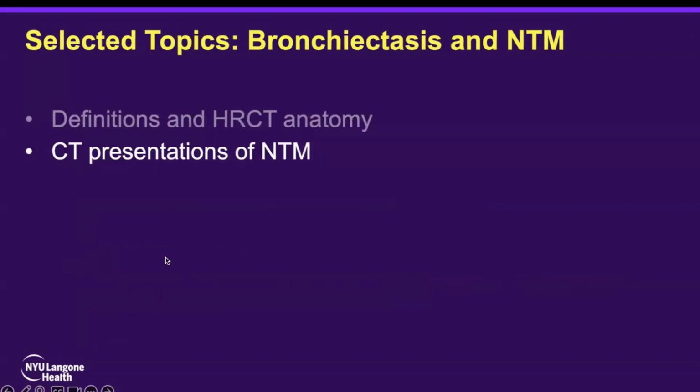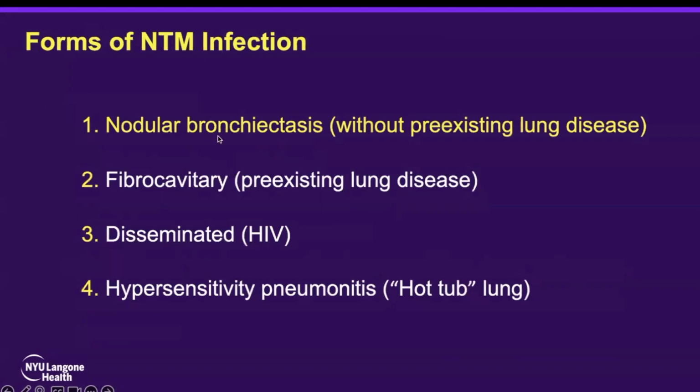So let's move on to the CT presentations of nontuberculous mycobacteria. There are 4 differing presentations. The first, the nodular bronchiectasis presentation, fibrocavitary and disseminated disease, and hypersensitivity pneumonitis.